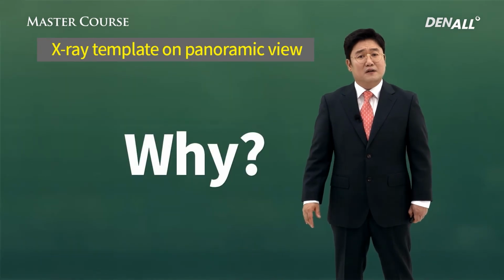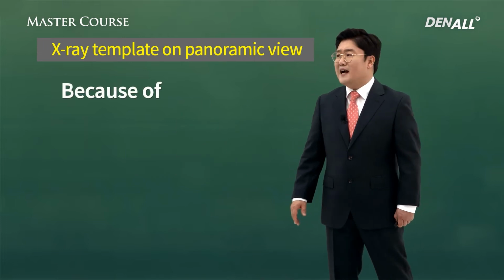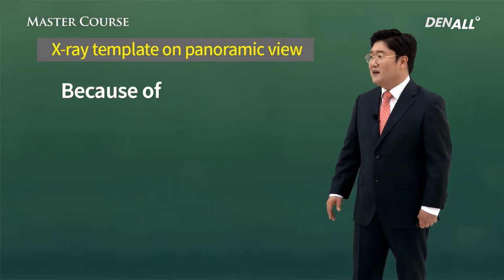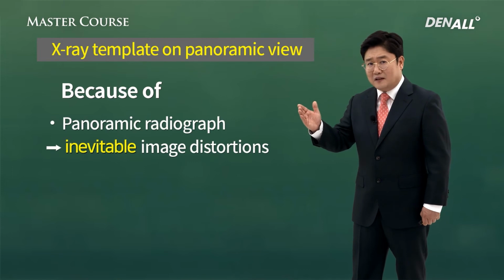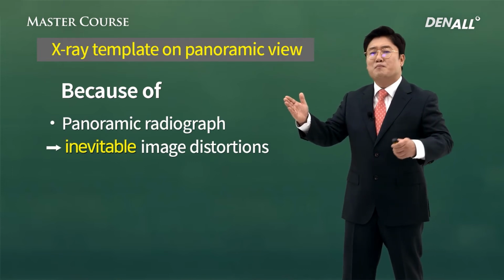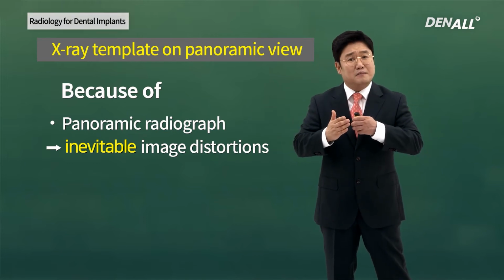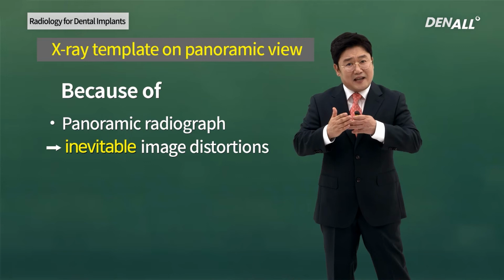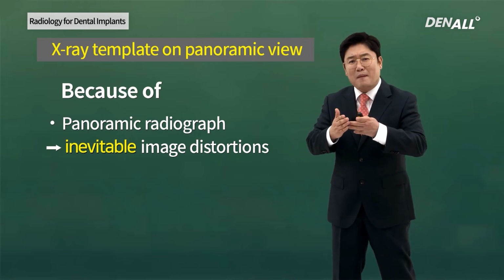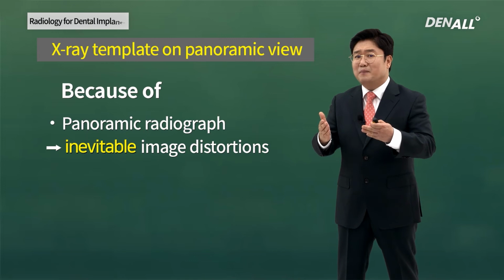Why? I believe you know, but because panorama is a spread out picture, inevitable image distortions occur. The image size is changed from the original size.